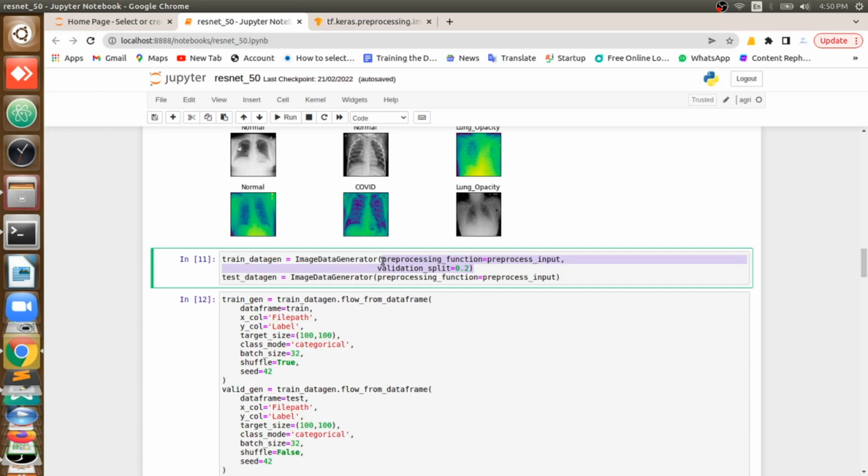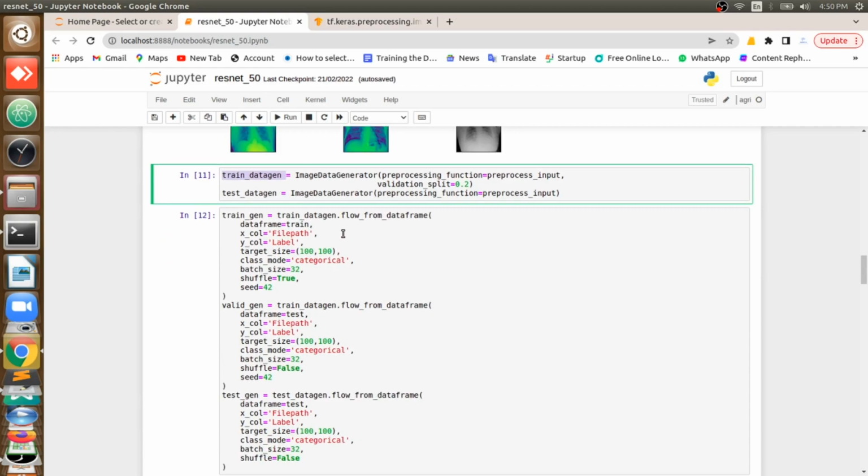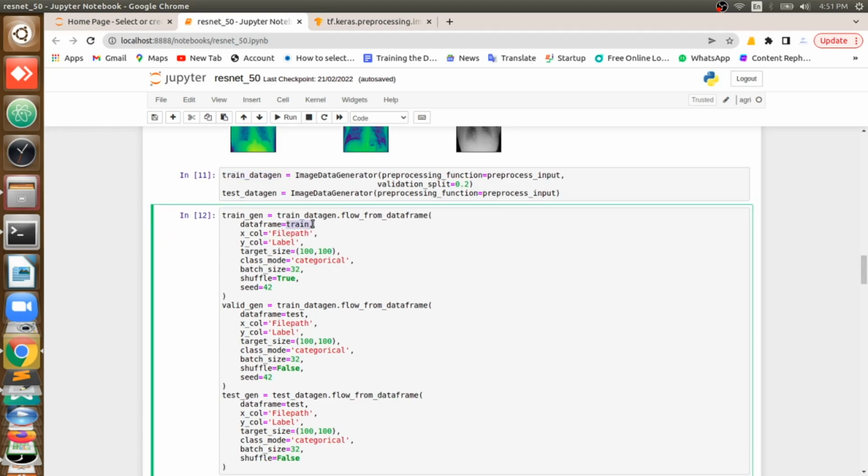You need to cut that into some parts and you need to show him like that. That is augmentation. It means changing the rotation angles, zoom, or shifting. You do that and train the model, and it will train very well. Then here I am just taking it as a function, data gen, but I need to apply this function all over my data frame. That I am doing here.